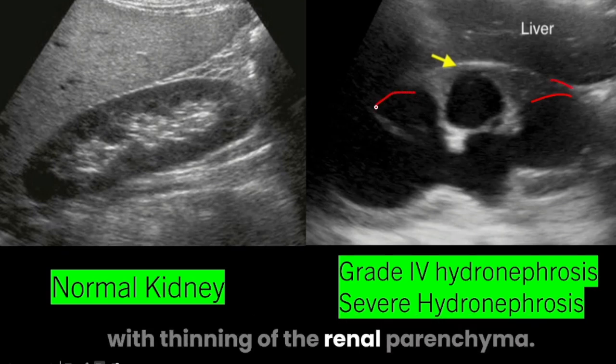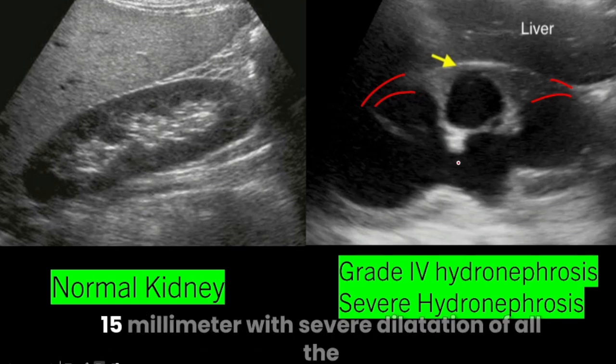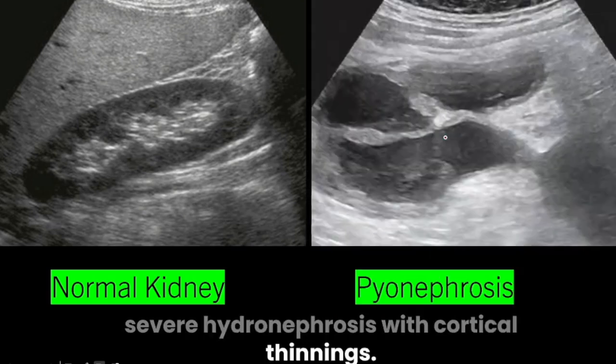In this image, you can see there is a severe dilatation of the pelvicalyceal system with thinning of the renal parenchyma. Normal parenchymal thickness is 15 to 20 mm. So if the renal parenchyma is less than 15 mm with severe dilatation of all the calyceal system, this is considered as severe hydronephrosis. In this image, you can see severe hydronephrosis with cortical thinning.